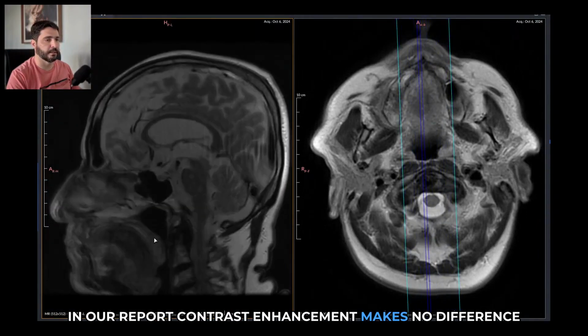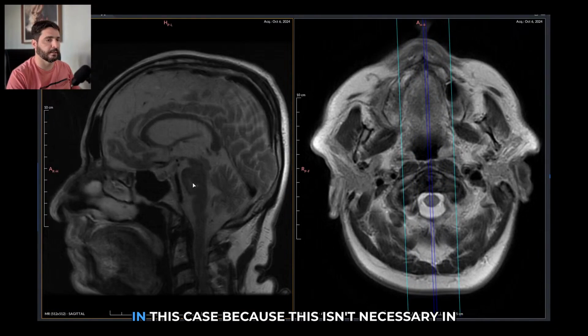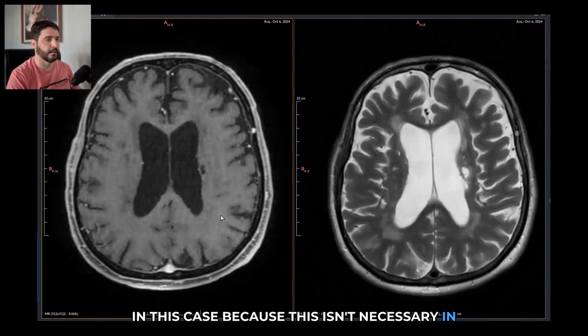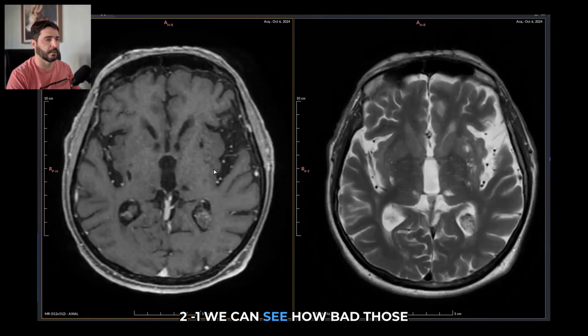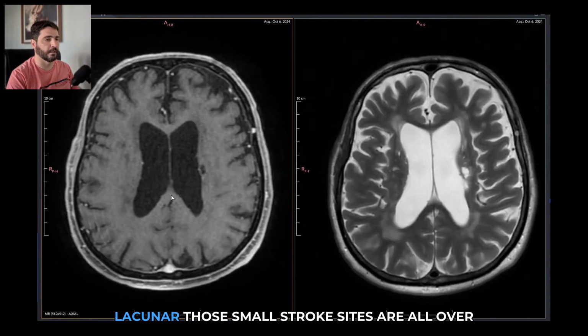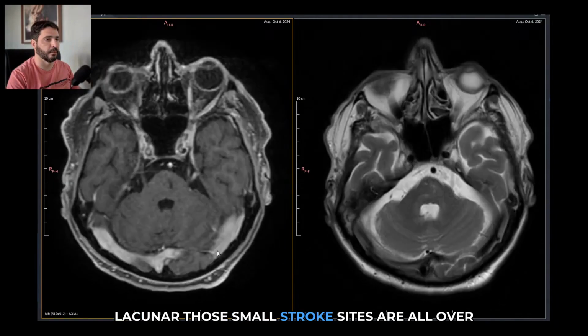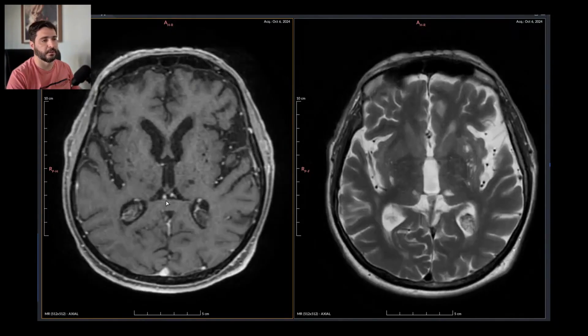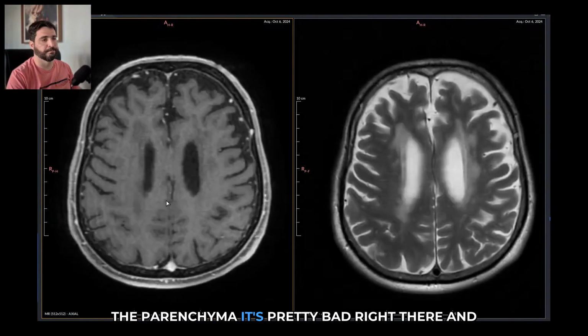Contrast enhancement makes no difference in this case because it isn't necessary. In T1 we can see how bad those lacunar, those small stroke sites are all over the parenchyma.